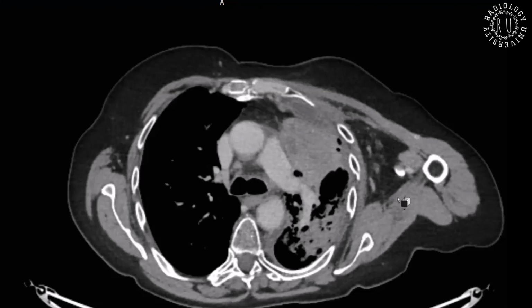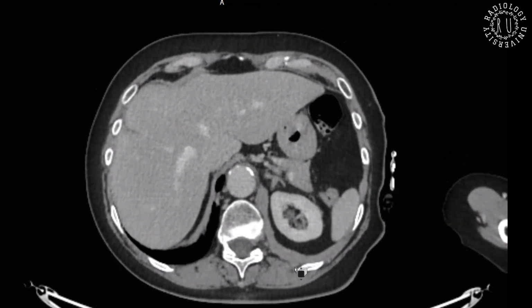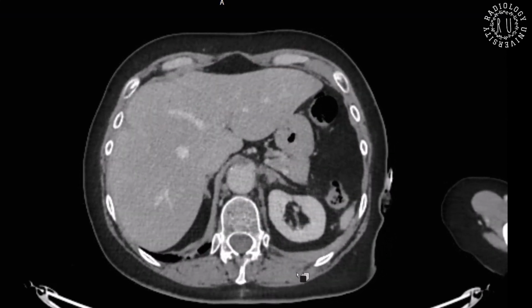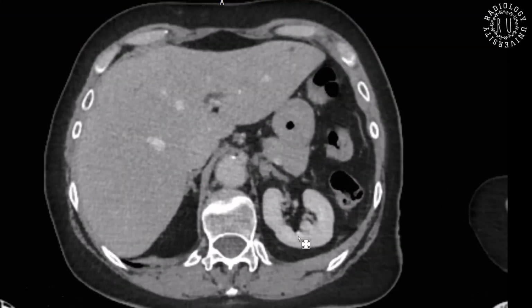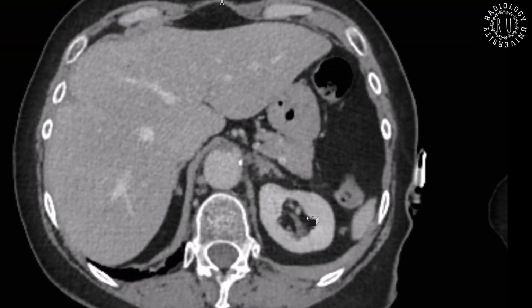there's no other growth or enhancing mass in the rest of the film, including the previously seen liver and also partly included adrenal glands. And I'll also scan through the contralateral lung fields for other mass lesions as well. That's the adrenal gland. Do you want to comment whether that's left side adrenal?